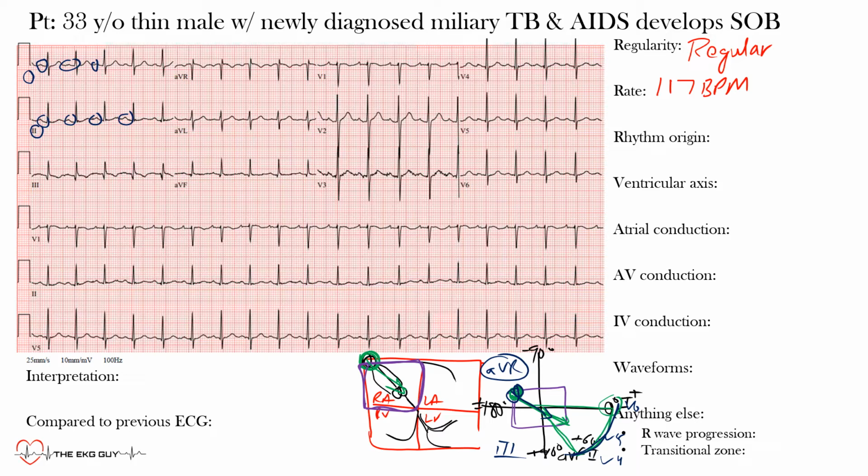Notice the same morphology in V4, right? These are the left lateral leads, and here's V4, V5 and V6, same thing. All the same morphology. Notice that they're preceding every QRS complex. There's a 1-to-1 ratio. And then when we look here at AVR, we see these inverted P waves, okay, preceding a QRS complex, just as we would expect in sinus rhythm, okay?